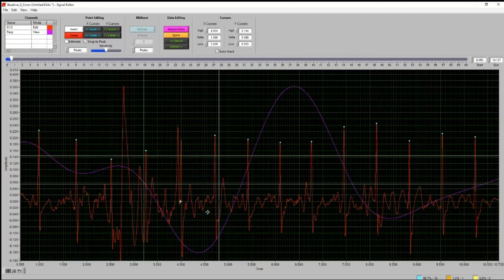So what we're trying to do once again is continue the data series, the ECG series, with minimal data added or removed to the FFT. By doing this, we're introducing 2 interbeat intervals in which there is 0 variance. And that would be a very proper edit to do. We certainly don't want to delete this and move it up to some random amplitude to pretend that we know that's there. Again, the amplitude is not the most important thing here. It's the time between beats, which is held constant here, whether it's at 0 or up higher.